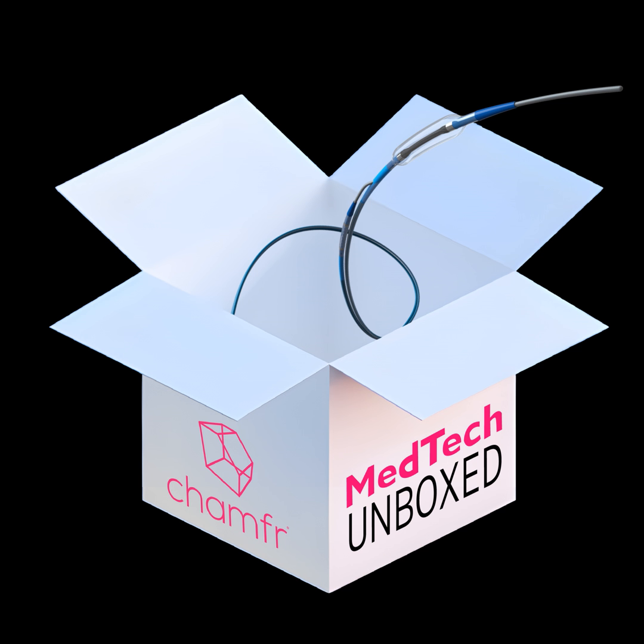It's also a fully featured static catheter calculator. So we'll calculate for each section you defined buckling, kink radius, tensile failure, torque failure, stiffness properties, everything you would expect from a static catheter calculator.